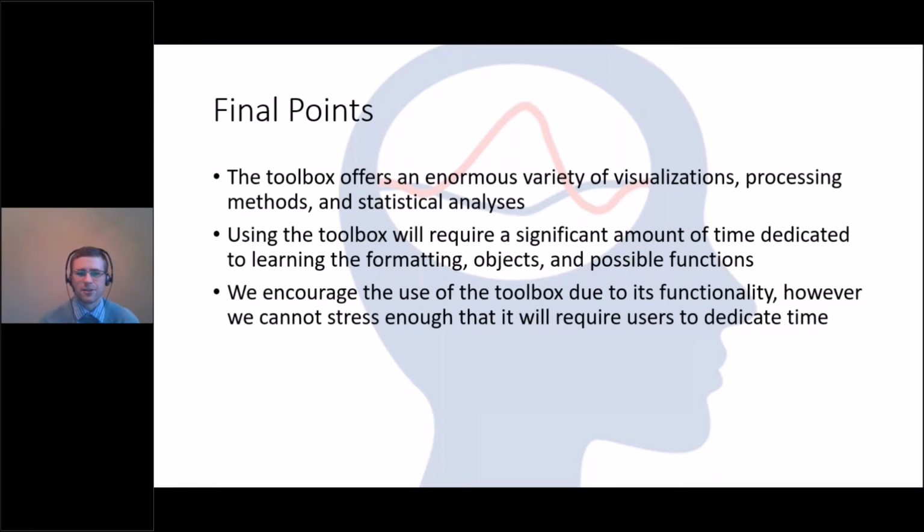I do want to mention, you have pretty much anything you could ever want to do with this toolbox, but it absolutely requires dedication of time. There's so many things hidden away in it that you have to figure out where they are. So you have to set time aside. If you're planning on using this, you're going to have to be willing to dig. You're going to have to open up some folders. You're going to have to go through it.